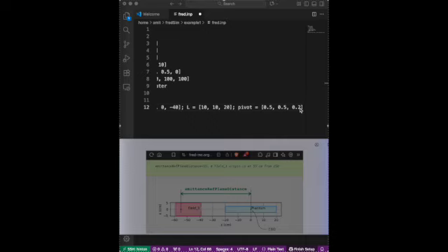And what does this 0.2 or 20% mean? That means this example is for a different case. For this case, 0.2 means 20% inside this plane.